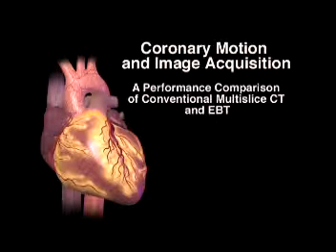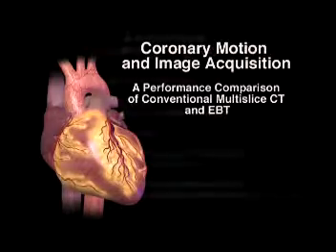The heart and its coronary arteries are in constant motion and therefore are very difficult to image. This animation demonstrates the complex motion of the coronaries and analyzes the exact timing required to capture a precise image of each individual coronary artery.